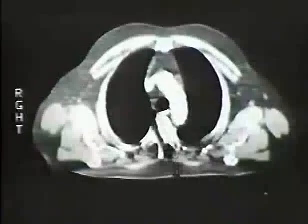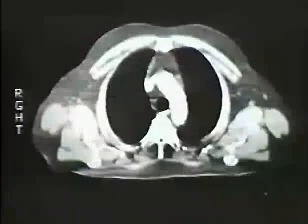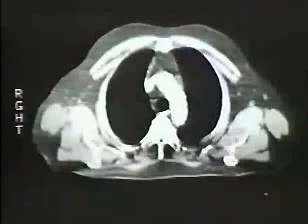Notice the tracheal air shadow and the thin line of tissue just on the right side of the trachea, consisting of fat, plus, of course, the pleural surface of the mediastinum and the wall of the trachea. Notice that there is an irregular density posterior to the trachea, leaning toward the aorta. This, of course, represents the esophagus.